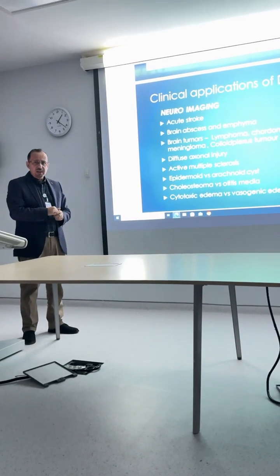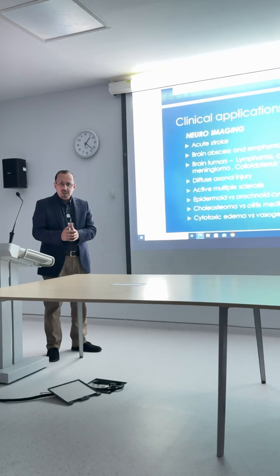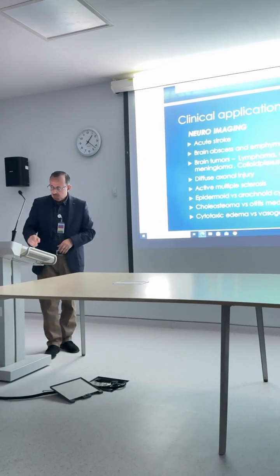It will be shown as the brightest, but the discriminator is the ADC. In cytotoxic edema, the ADC is hypointense. In vasogenic edema, the ADC is hyperintense due to shine-through.